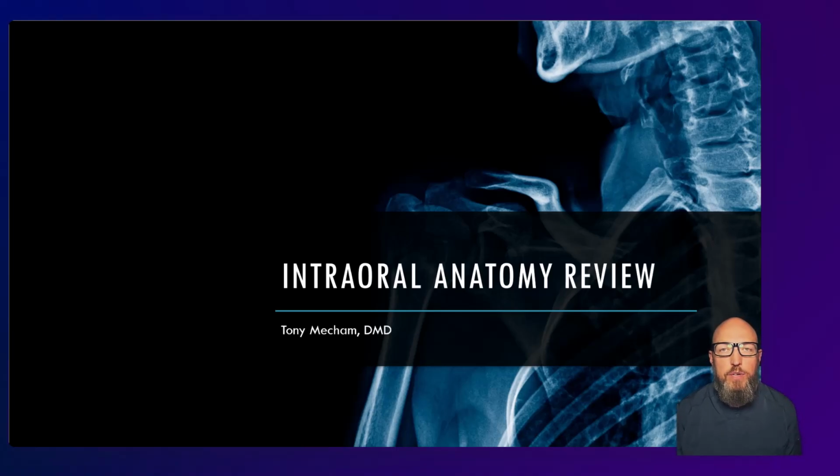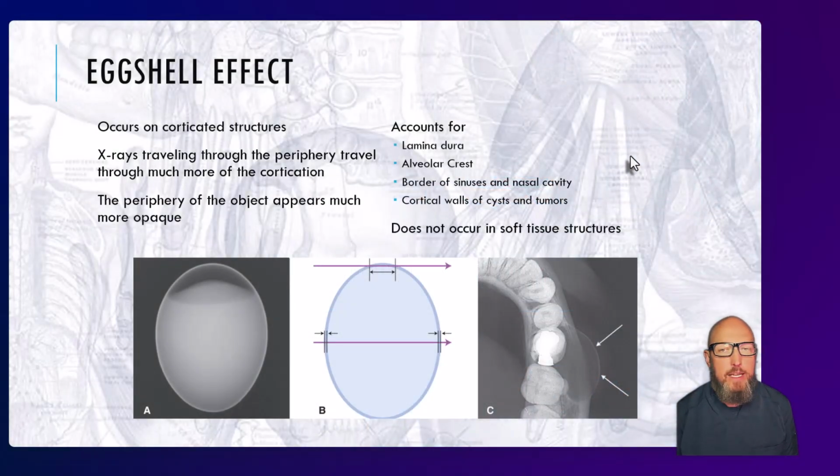So again, this is review material. You should have had radiographic anatomy before. I'm going to go pretty quickly. If something feels unfamiliar, treat that as a signal that you need to go back and review some of the previous material. First concept here is the eggshell effect.